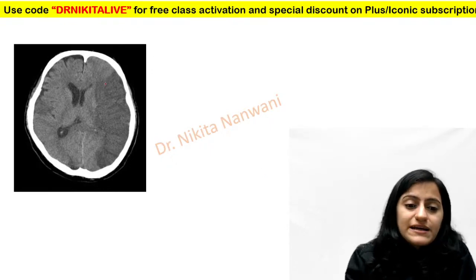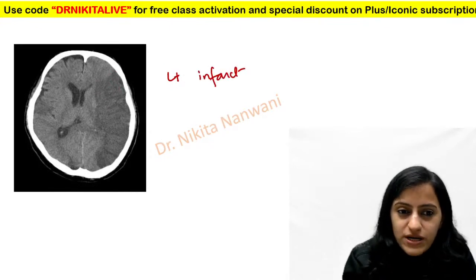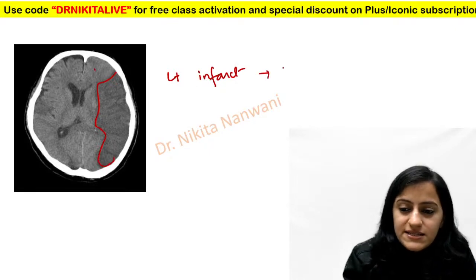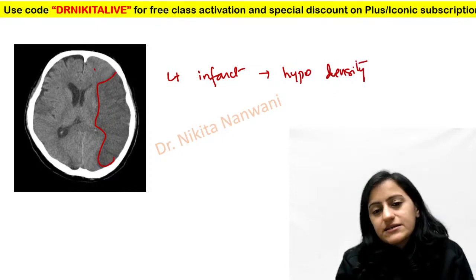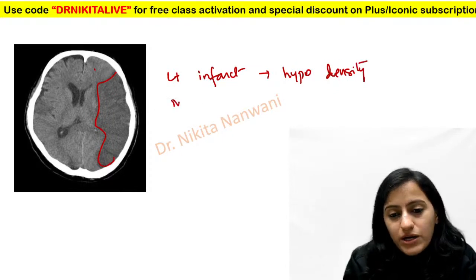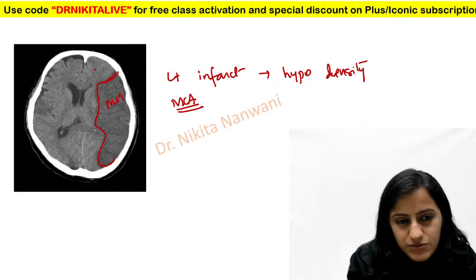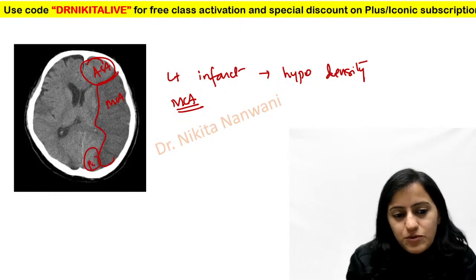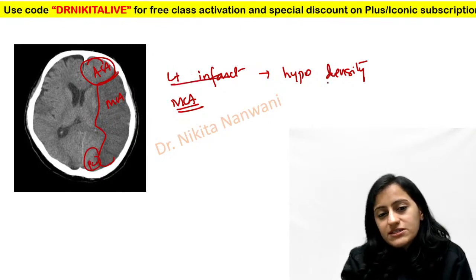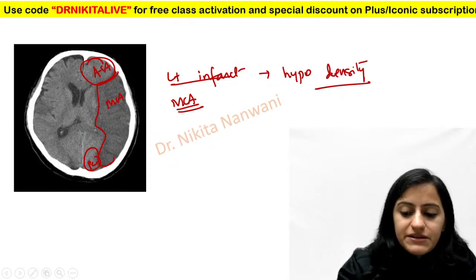Yes, absolutely right. On the left side, you can see that there is a hypodensity. This area is more dark as compared to the rest. This is a hypodensity. Then it is your infarct. What territory? This is MCA infarct. In the middle, this is going to be MCA. This is anterior cerebral artery. This is posterior cerebral artery. So this is left-sided infarct, left MCA infarct. Okay, this is left MCA infarct.